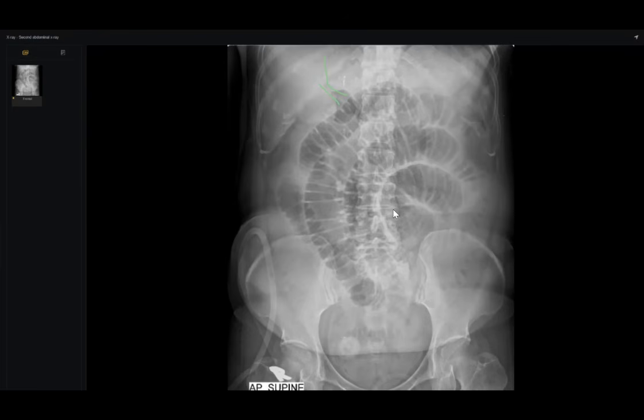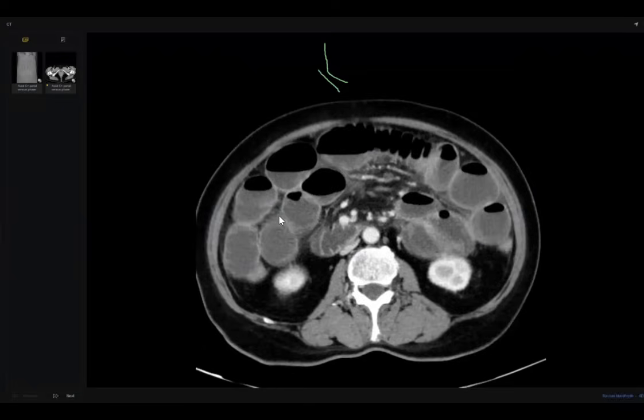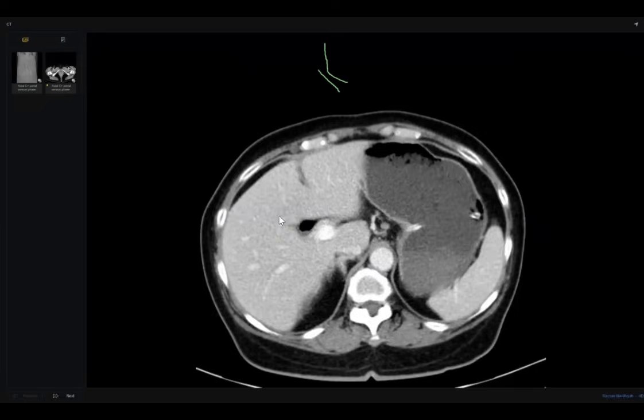I told you many times before, viva and oral examination sometimes depend on guessing and expectation. Sure, there are CTs, but in very simple cases like this, he will not give you the CT, because it is very simple. I think it was very clear.